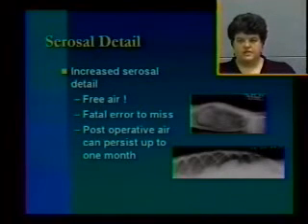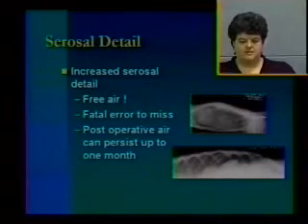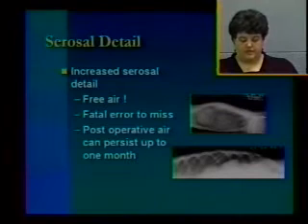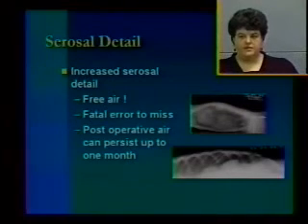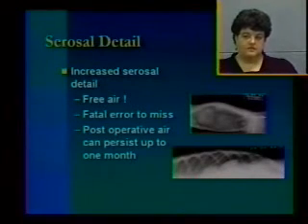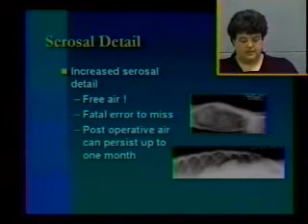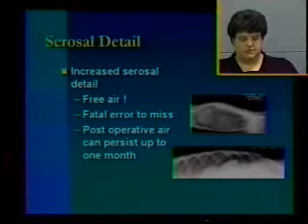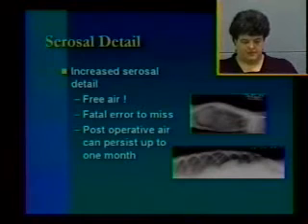If you have any concerns, if you see an unusual gas bubble outside of a GI tract, or gas dissecting between the liver and the diaphragm, which are the typical places to identify it radiographically, go ahead and put the dog in left lateral recumbency, and if you have the potential, shoot across the dog and across the table. The air will float up to the top and outline the diaphragm, as you see here. With the lungs on one side and the free air in the abdomen, you outline both sides of the diaphragm, and then you can actually see the liver lobes being outlined, the rounded structure right underneath the ribs.